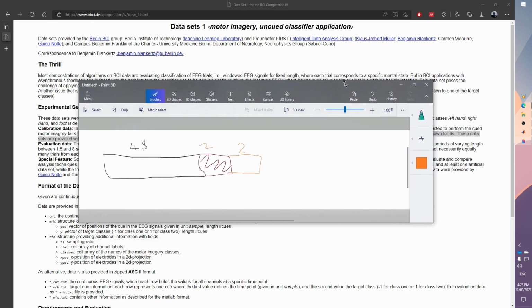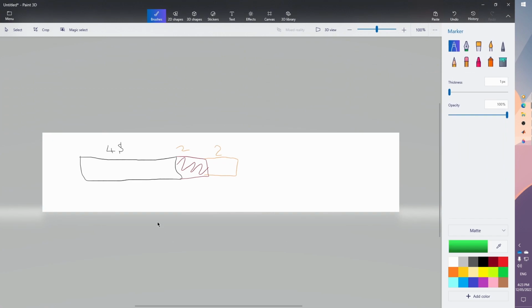So it's quite nice to have this task, because it's clear what they are doing, and it's also available for free, so you can download it and explore it immediately. So there is a fixation cross here, and I think it was repeating. I would represent the onset of the cues, or the external stimulus that was appearing to participants, by this arrow right here.